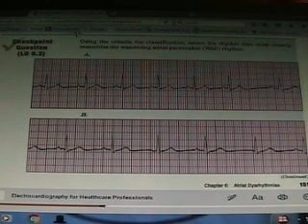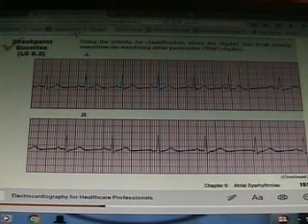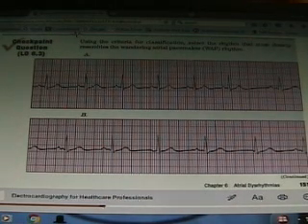A or B? A. A looks more normal, right? But we definitely know that A isn't normal because, do you see that last part? Yeah. It's slightly irregular. And I'm looking at this, what, 4 boxes. This is like 4 boxes, 4 boxes, a little less than 4 boxes, 4 boxes, and then it gets what? 1, 2, 3, 4, 5, 5.5 big boxes.